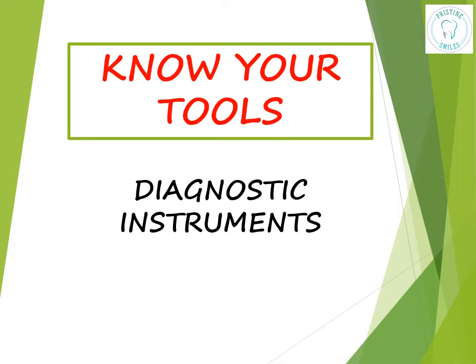Diagnosis is the identification of the nature of the problem by examination of the symptoms. When a patient comes to you with a dental problem, you need a set of basic instruments to check and evaluate the various parameters and then, if required, advise further investigations before finally coming up with a diagnosis. These instruments that aid in diagnosis are called diagnostic instruments.